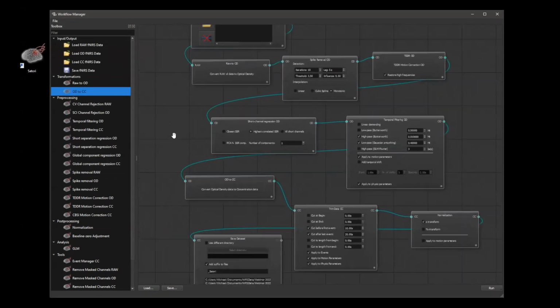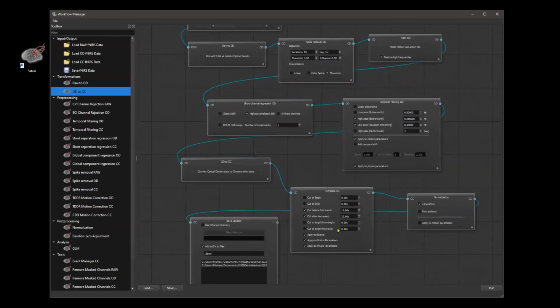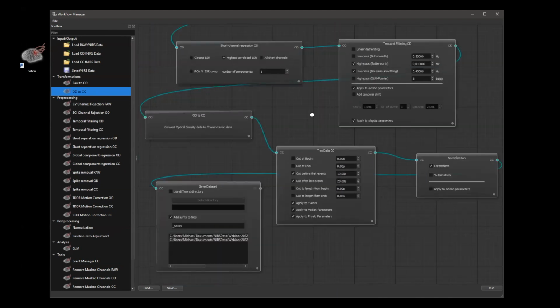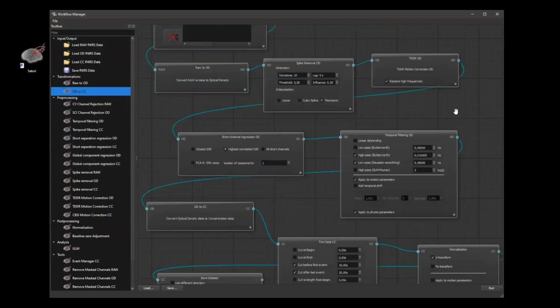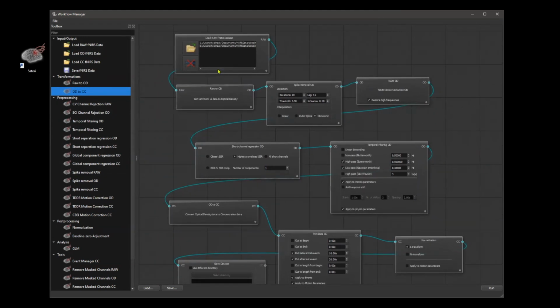Now we can see that they are becoming bigger and including more features in the whole set. But you can just zoom in to see what they are doing. But in case that you want to share this data, you can just save it as a flow, for example. And you can share this with other people that use Satori or the Satori educational version. So you can just open them in Satori, look at them in this way, and then see if all the parameters that you define are the ones that you want to have. And otherwise, yeah, just cross-check with people that everything is set correctly.